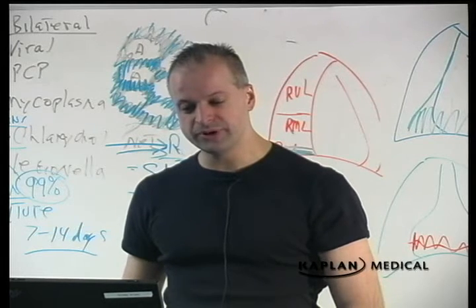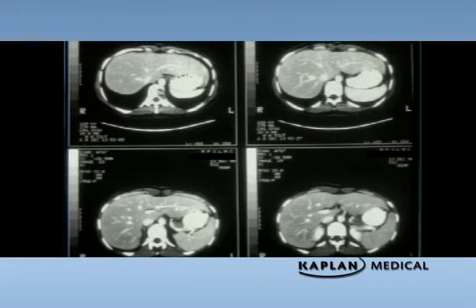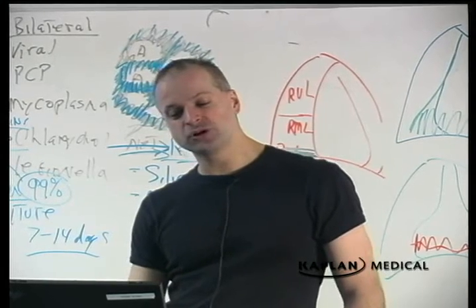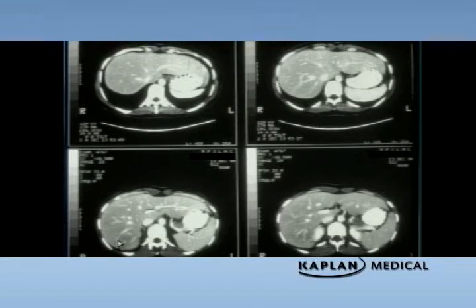Rib, spinal cord in the center, vertebral body, rib, spleen, liver, stomach. Gallbladder over here. These are paraspinal muscles, and these are what are keeping you standing upright. Why don't your ribs flop over like a slinky? Because you have paraspinal muscles and the slinky doesn't. And this is all liver. This is not abnormally enlarged. This is normal. Normal abdominal CT scan.